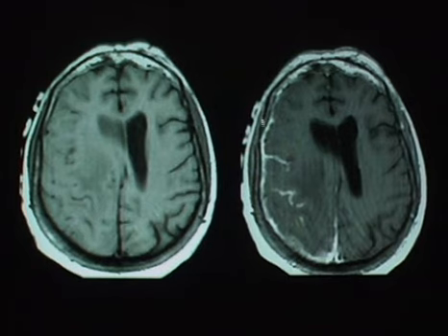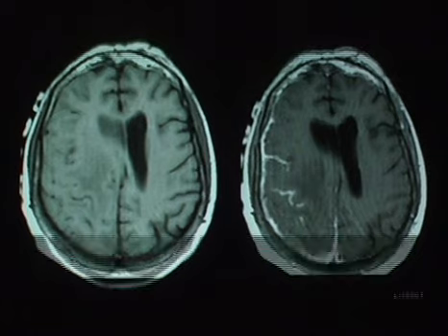this is a patient with fiducial markers along the scalp for a planned resection. This patient had leptomeningeal disease resulting from metastatic breast carcinoma. Other metastatic neoplasms, primary glial neoplasms, and lymphoma can produce a similar appearance. And also remember that in the setting of leptomeningeal disease, another possibility is something like sarcoid, where you have granulomatous inflammatory disease resulting in this kind of meningeal enhancement.